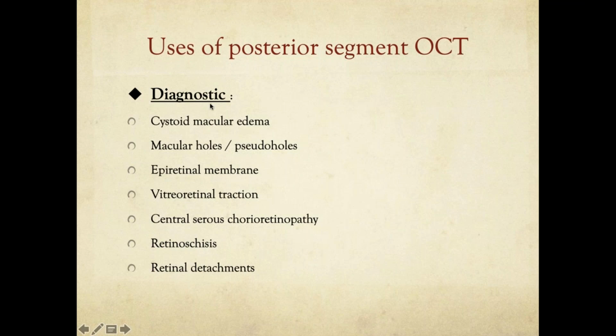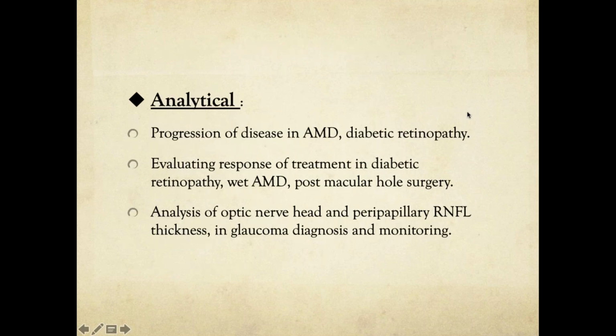Then these are the group of patients that can cause you trouble, because you don't do a cataract surgery to just save the vision that they have. Cataract surgeries are usually indicated to improve the vision. So if you have missed those kind of retinal findings in the OCT, these kind of patients will especially cause you a lot of trouble. So always please consider the macular volume and the cystoid macular edema when you're looking at any OCT reports.